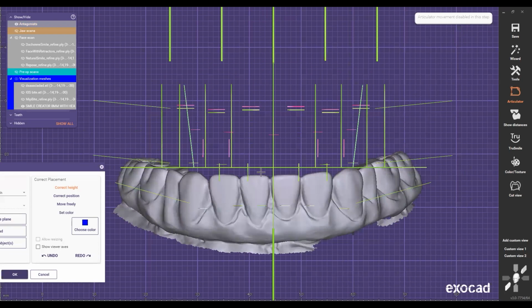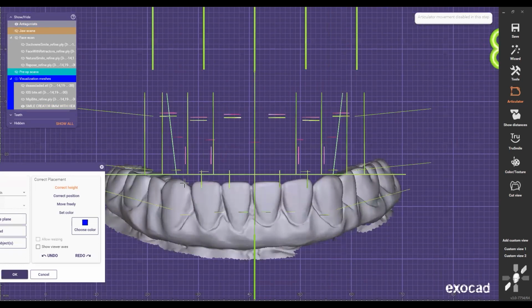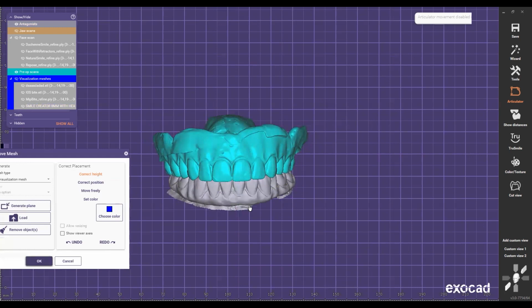And those are the beautiful things that, once you start doing these cases, you understand how to troubleshoot it. You understand how to set it up properly. So in case my lowers are not in the ideal setup, how am I gonna fix this? And that's one of the nice things that you learn when you're doing these cases. Because here I can see that I'm gonna have to bring the teeth lower, because I can imagine my setup right there. So now I'm gonna start the case. I know my incisal edge position and I just leave it there.